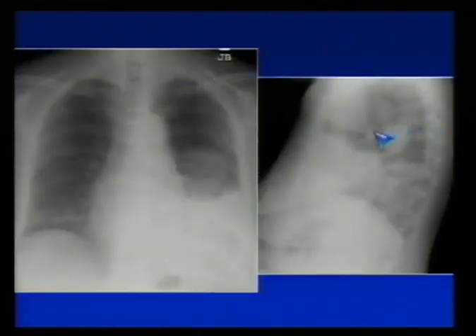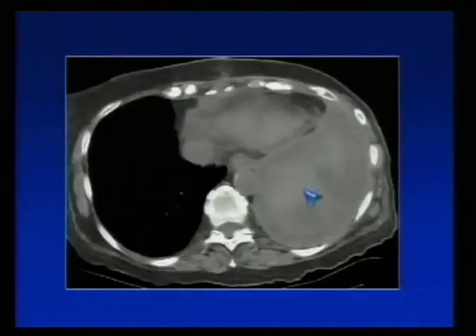So what's this? Lung cancer? Well, it looks like it's right along the fissure. This happens to be a loculated pleural fluid collection. Remember that as a possibility. How about this? What's this? Patient who was on anticoagulation. This is a hemothorax. You can see central heterogeneous high density hemothorax.